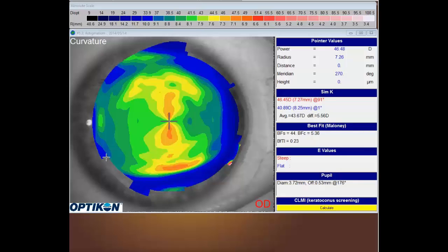And when you visualize how the lens will sit on the eye, it'll help you anticipate how the lens may or may not perform as predicted by the software. This really helps you troubleshoot later on if you need to make some adjustments.